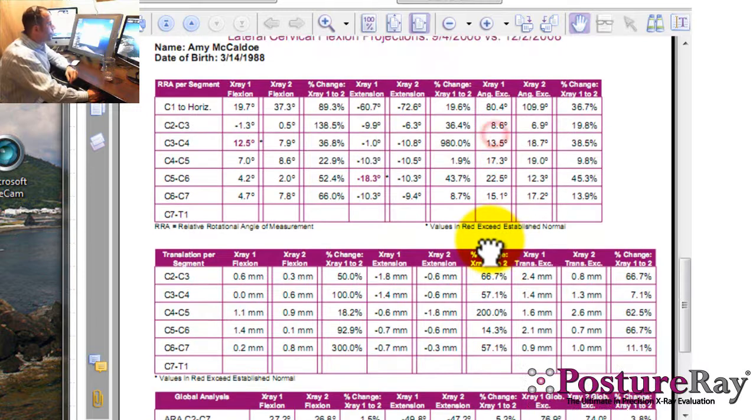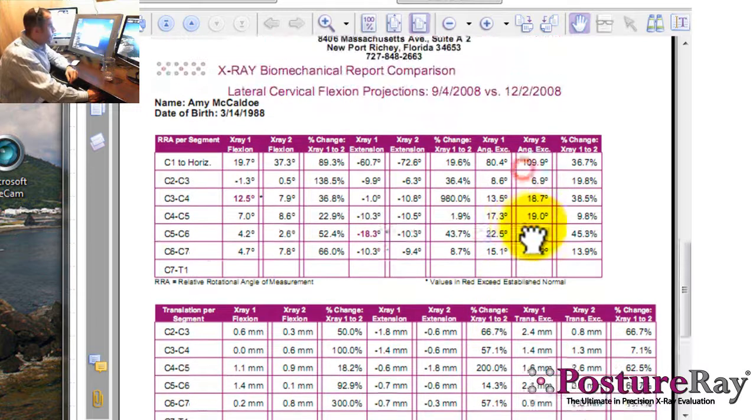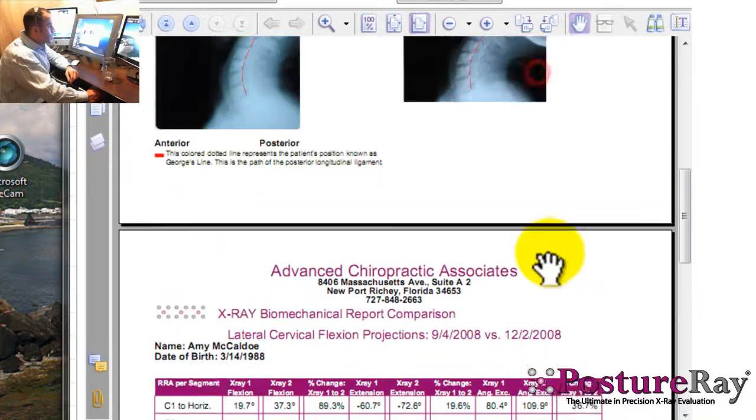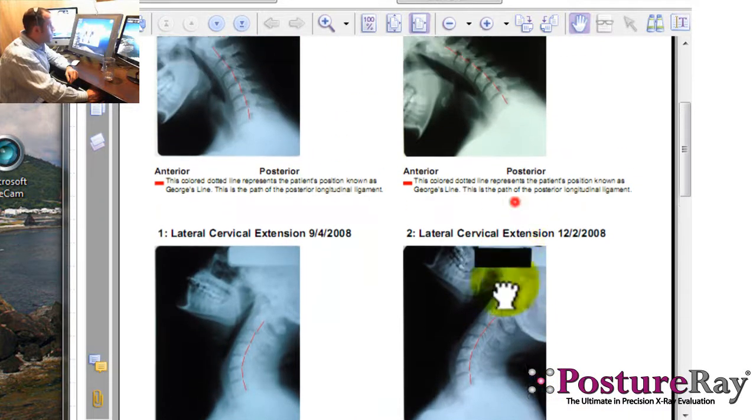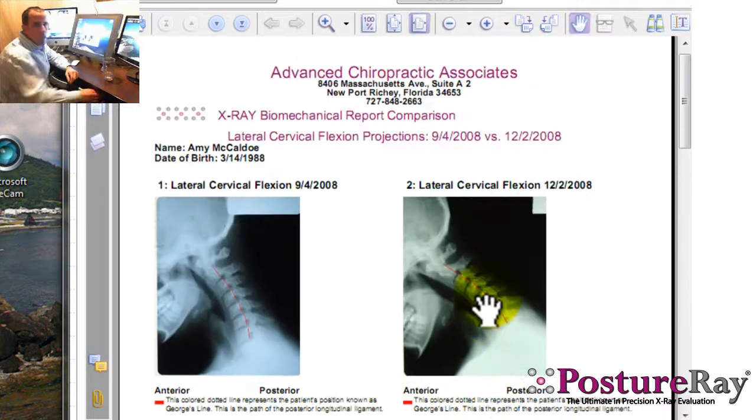So you can do this before and after an injury. So you could have a good neck going to a bad neck after an injury, or vice versa after corrective care. So it's a good way not only to educate your patient, but also educate third parties, albeit like an insurance company or workers' compensation, or an attorney for a med-legal automobile PI case.